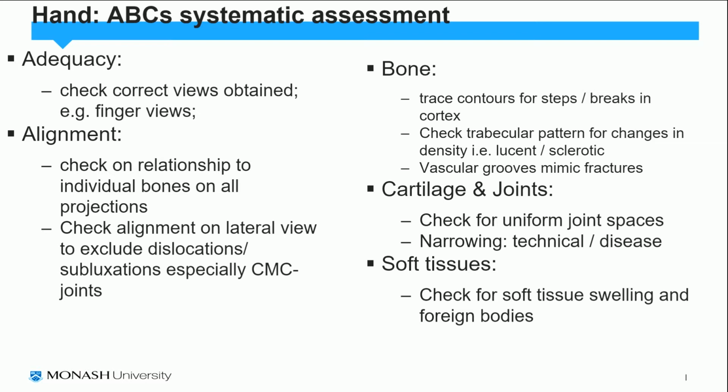And then vascular grooves, be aware of that. They're grooves that you see from the margin, from the cortex up to the middle, and they can mimic fractures.